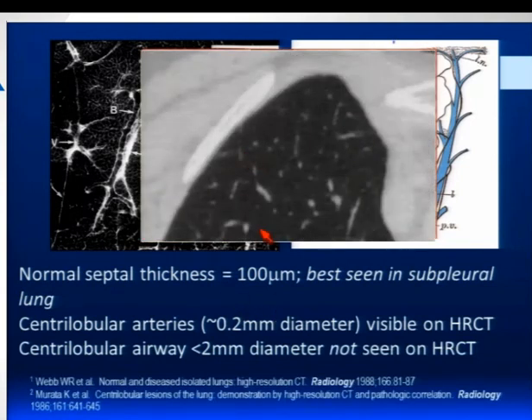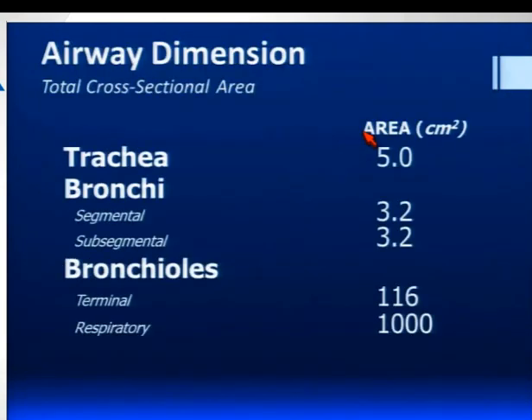This is a very targeted section of the lung, and you can just see the makings of a pulmonary lobule here, with the dot in the middle representing the lobular artery, and the airway next to it, which you won't see in normals. This is also important to consider.